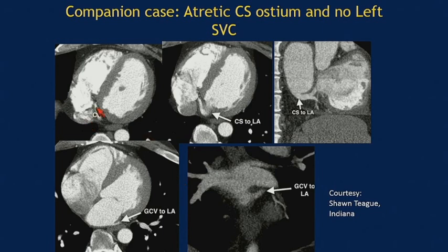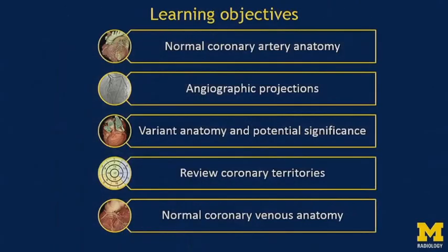So in this particular patient, again, this is the ostial atresia. What this patient has, you nicely see it on the sagittal image, is that the coronary veins and the coronary sinus were draining into the left atrium. There was another connection with the great cardiac vein here. So this patient actually has these small connections with the left atrium. Obviously, it induces a tiny bit of shunt, but that shunt is not significant. It's a very small amount of shunt. But this is the way for that coronary venous blood to get back into the heart.